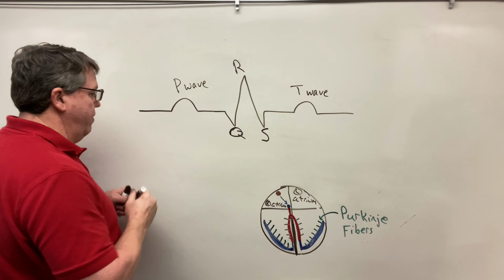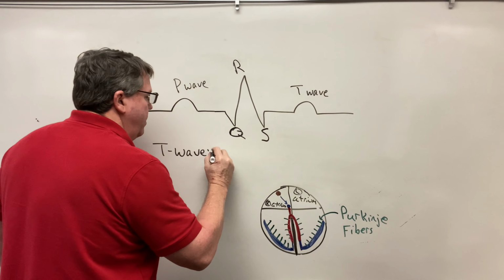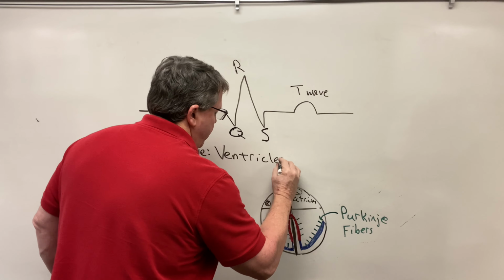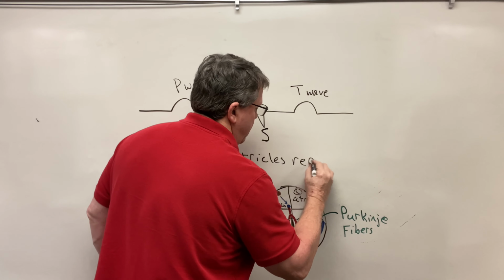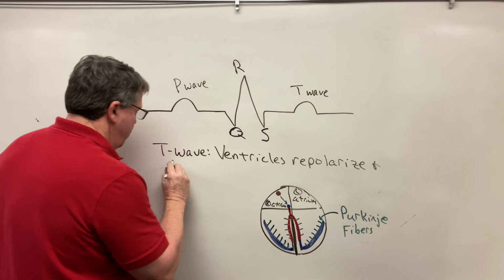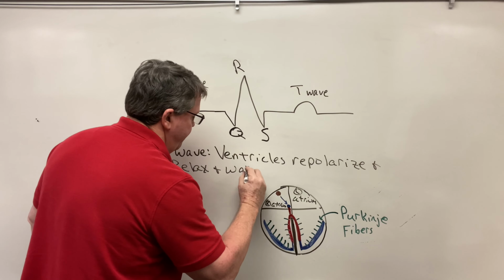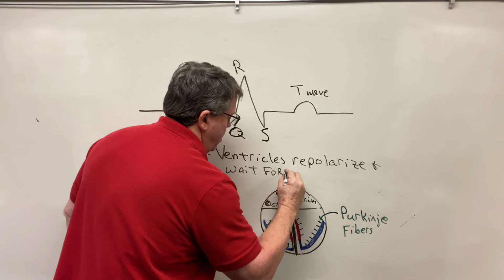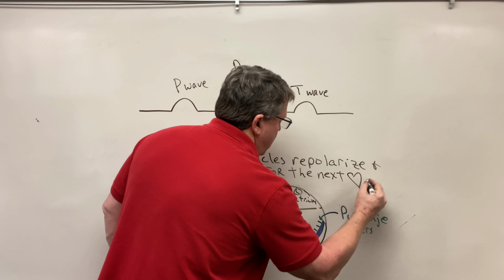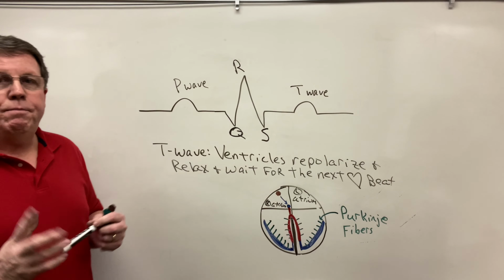Okay, so now on the T wave, the ventricles repolarize, and relax, and wait for the next heartbeat. Okay, so that's what's going to happen there.